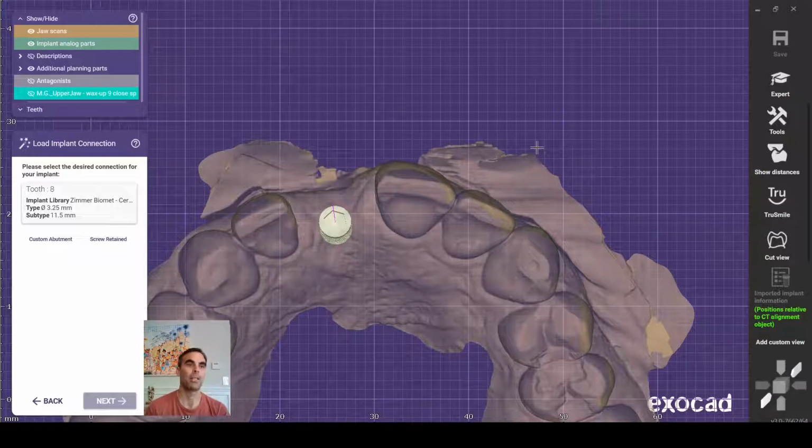So basically we had to determine if we were going to edit the jaw scan and make one of the single centrals bigger so that when we mirrored, let's say when we mirrored number 9, number 8 was the same size and it also filled the space. So when we mirrored number 9 initially, there were diastemas on either side of number 8. So we then had to go back in and sort of resize that.